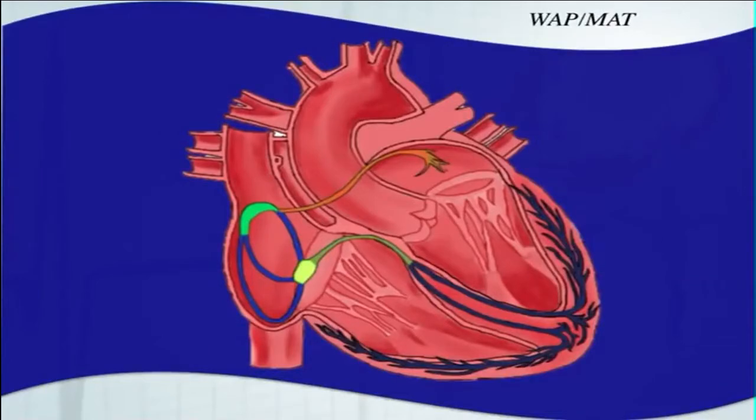The next arrhythmia we're going to talk about is wandering atrial pacemaker and multifocal atrial tachycardia. These are both sort of the same concept. What happens is you'll have all of these different atrial foci. For instance, the atrium will depolarize from over here and cause ventricular depolarization to occur. And then the next beat, it might occur over here and then cause ventricular depolarization to occur. And then over here and cause ventricular depolarization to occur. So again, it's not a sinus rhythm because it's a different part within the atria that's causing the depolarization.